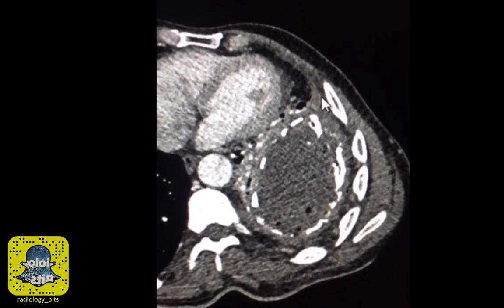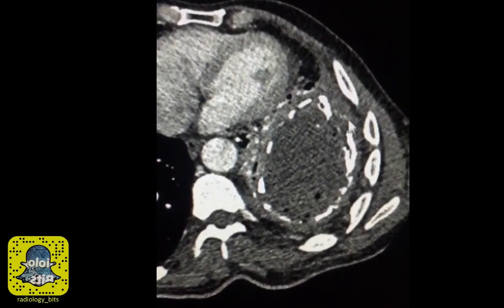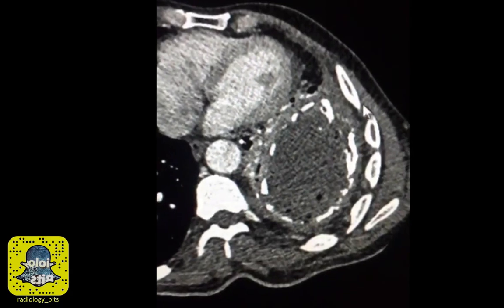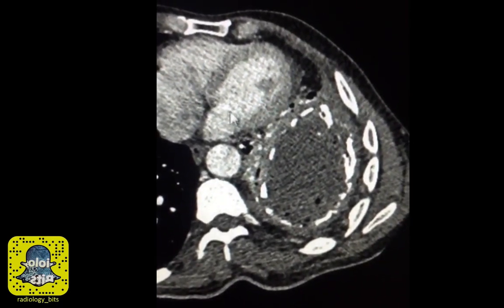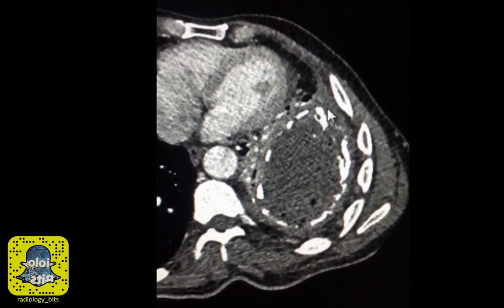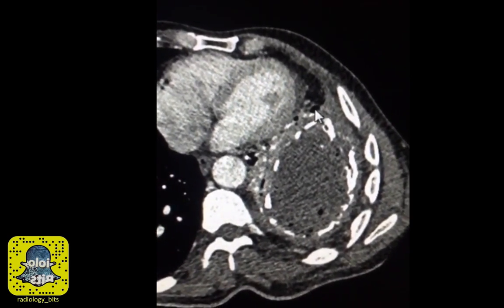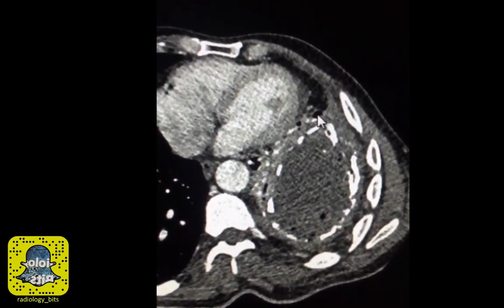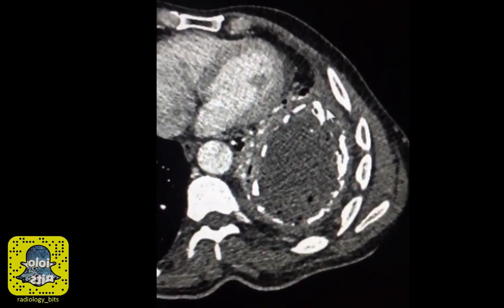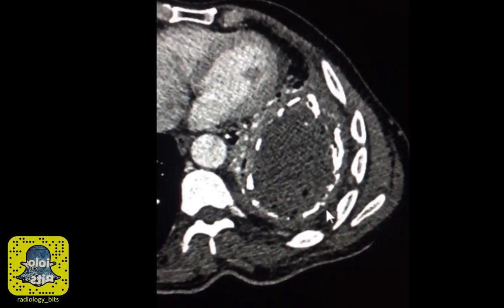Whenever you see pleural thickening, please assess the thickening very carefully. Note that the timing of acquiring the CT after giving contrast is important. When the timing is more arterial, such as what we see here, enhancement of the pleural space is difficult to detect. Enhancement of the serosal surfaces, such as the pleura, is better appreciated when you take an image at a delayed acquisition, such as a portovenous phase. Despite that fact, you still have to assess the pleura very carefully and try to change the window so it could differentiate between fluid and soft tissue components.